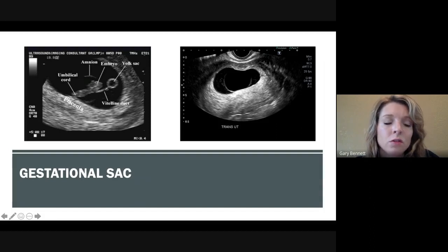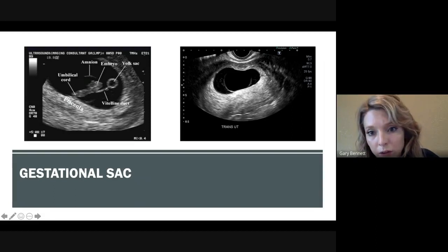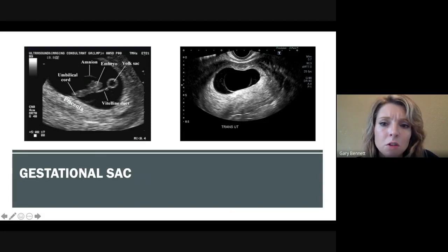So I do want you to be aware of that. Oh, we have a nice picture of it over here. You'll see that very often. Honestly, mostly I want you to be aware of it so you're not concerned that it might be something else. I've seen it miscalled as some weird stuff. So this is just the amnion. It's going to grow in with the chorion as baby progresses, but that's what it looks like at this stage. So I think this is a nice little picture here just to help us understand exactly what we're looking at right there.